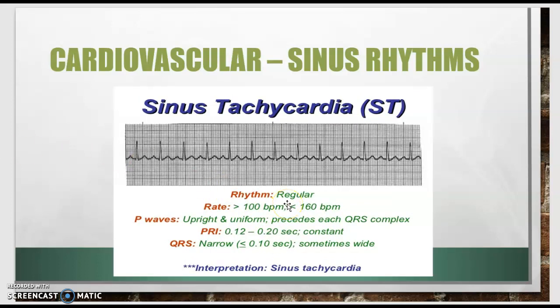Next, we have sinus tachycardia. This was one that some people got mixed up on the worksheet, so take note to this one. Again, everything down here is the same as normal sinus rhythm except for the rate. So is it regular? It is. Your QRSs, they march out. They come at the same time. There's the same amount of distance between them.